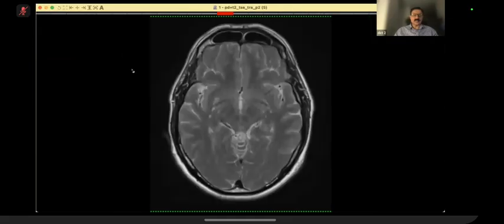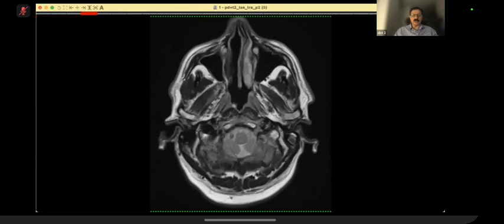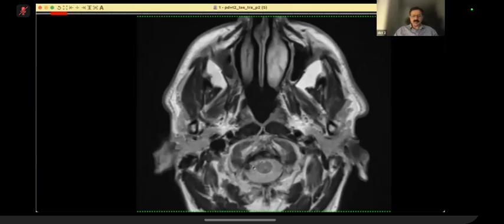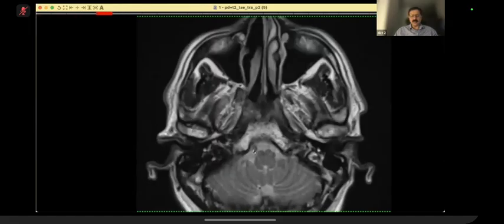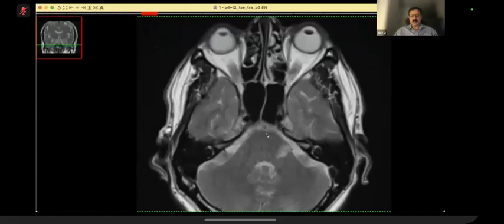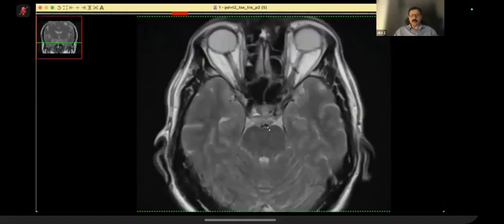Interestingly, on this, there is stigmata of something happening. Now, if you look carefully, look at this vertebral artery. It is prominent, which doesn't mean anything because one vertebral can normally be more prominent than the other. But if you look carefully, something is happening inside it. And then as we go, it makes the basilar artery. Here, there is a flow void, right?